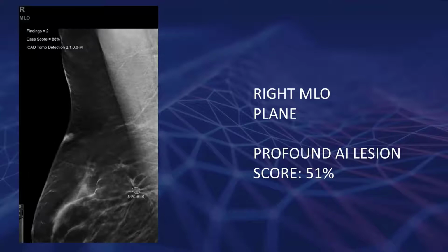Now, the radiologist that gave me this case said that at this point in his interpretation, he was actually distracted. He got a phone call and was pulled away from the screening desk. When he returned, he started working on this patient's report, describing both masses in the right breast, and putting regions of interest around both of these masses so that the technologist that would perform the patient's ultrasound when she came back would know exactly where to scan.